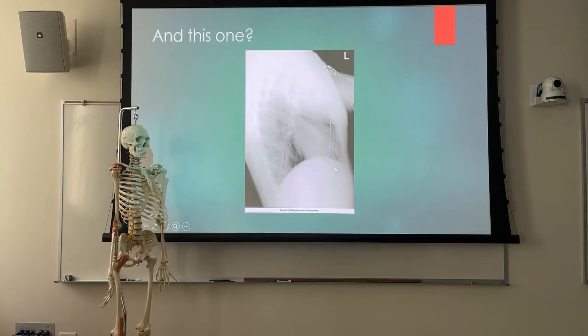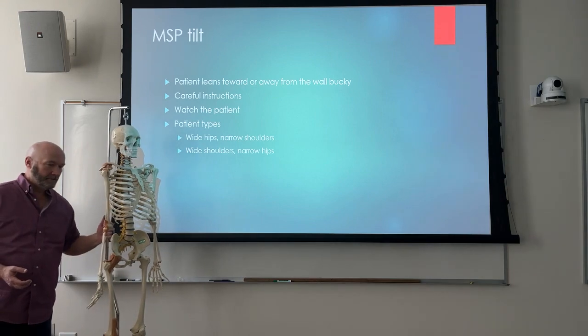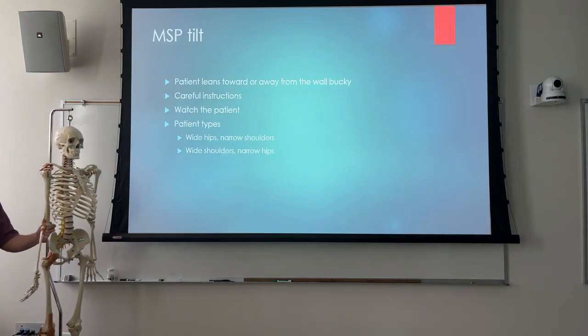On that one, again, what we've got here is a patient on telemetry, so again, this may be as good as this patient could do, but we've got not just soft tissue, but we've got bony superimposition over the upper portion of the lungs. You need to try to get those arms up if the patient can tolerate it. So this is where it gets a little bit more difficult.